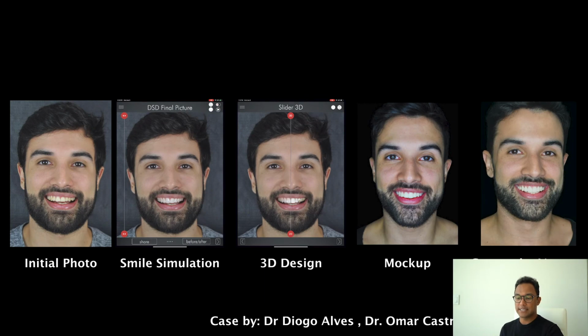So here is an example of a case done by me, Dr. Diogo Alves, Dr. Omar Castro, and Lucas in our office in Brazil. Here we have the initial photo. We then create a smile simulation. We jumped into the 3D design, set up the mock-up, and did composite veneers. And everything was done within 2 sessions.